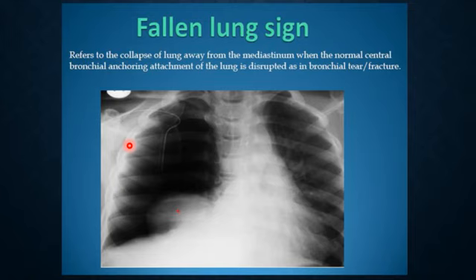Always. And severe, massive trauma. A patient will be in the emergency room or in the ICU in a very critical state. Most of the time it will be a portable X-ray. And you can obviously see here the presence of a possible what? Sorry? There is always pneumothorax here. What else other than pneumothorax? There is a tension pneumothorax. Okay, that needs immediate relief. You can see the heart is shifted to the other side, indicating tension. This is an emergency. This is a medico-legal thing.